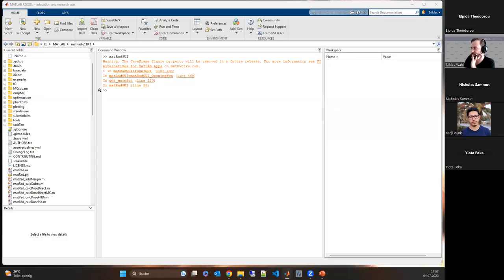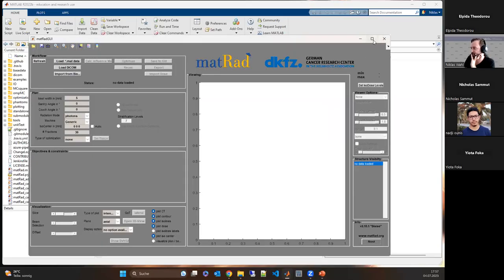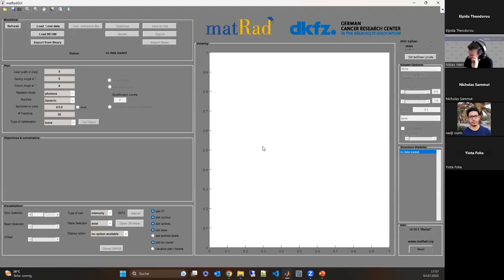It will give you a warning, but that's okay. And then you should end up with something like this. If this opens, basically you have managed.